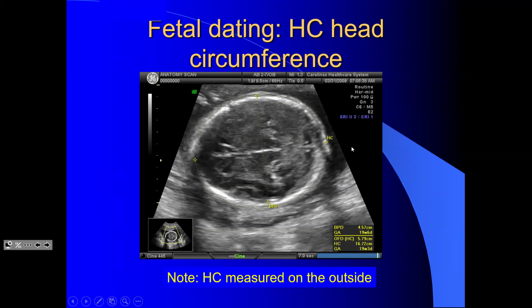We don't know because the baby is larger in size. So we have the other dimensions now, which we rely on more, like the biparietal diameter and the femur length. Is it for the age or is it to make sure that the baby is growing in a good way? It's for the age as well, and obviously if the measurements are smaller compared to the gestational age, then you also have to look for maybe the baby is a dwarf. If the parents are of small height, then the femur size might be small. Or if there is a dysplasia where the bones are shorter, then you have to look for the other bones as well.